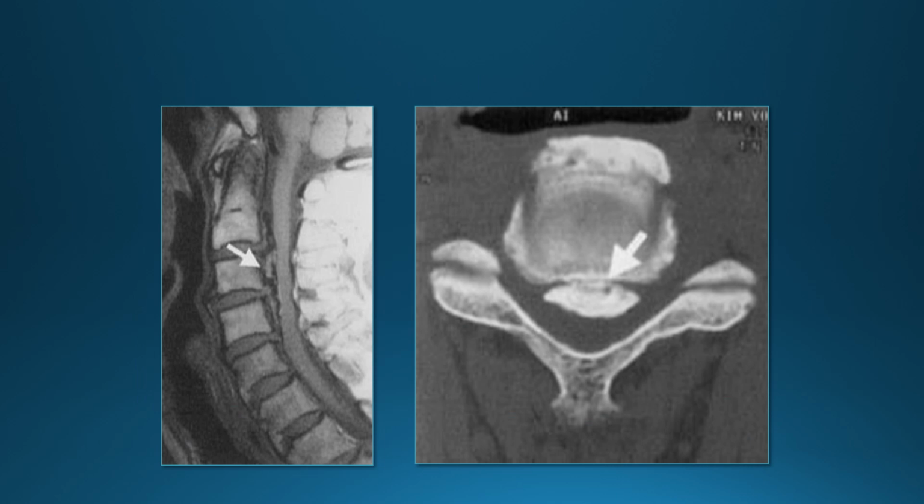And finally, this is a patient who has spinal stenosis due to this big calcified lesion coming out of the center of the vertebral bodies. This is a patient with OPLL, ossification of the posterior longitudinal ligament. Often it has this mushroom-shaped configuration, and it's typically more pronounced at the vertebral body level rather than at the disc level. So that way you can distinguish it from, say, just calcified disc herniation. So this is OPLL and often causes spinal stenosis.